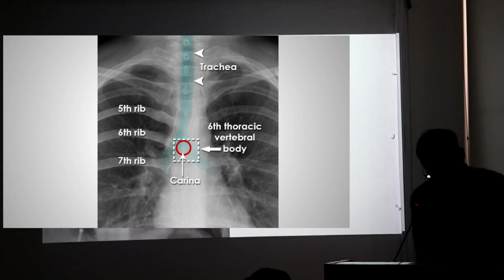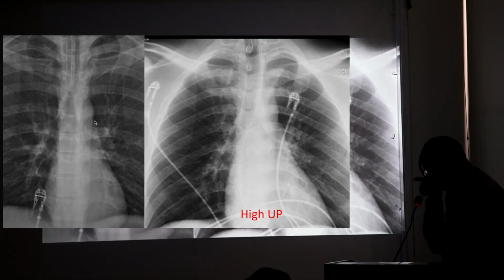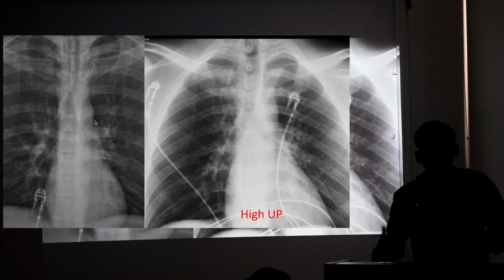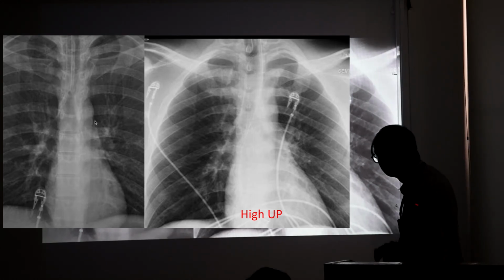Okay, so I'll show you cases and then we'll discuss. I hope the endotracheal tube is visible over here. So what happened over here? It is very high up. There might be an inadvertent extubation; self-extubation is possible if it's that high. I hope it's visible in the midline.